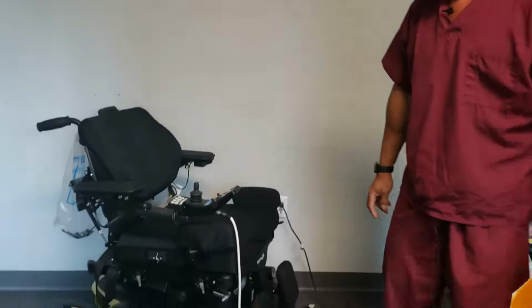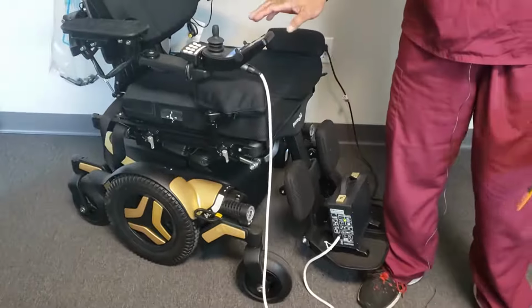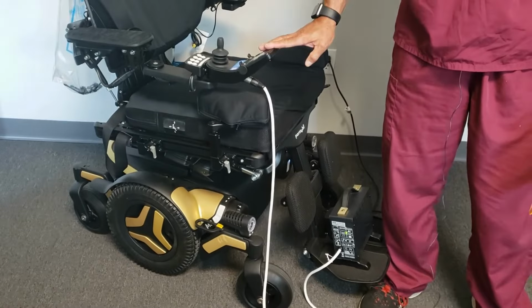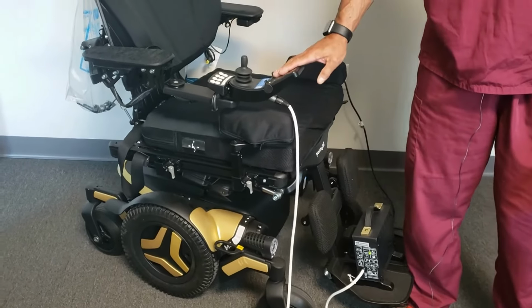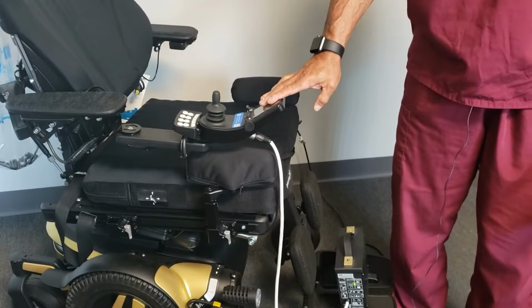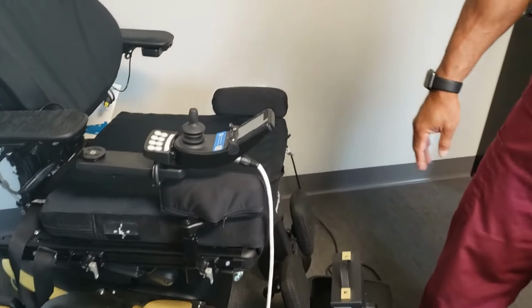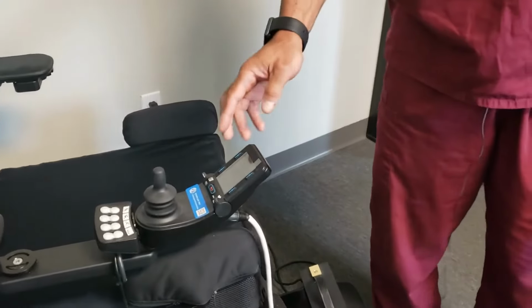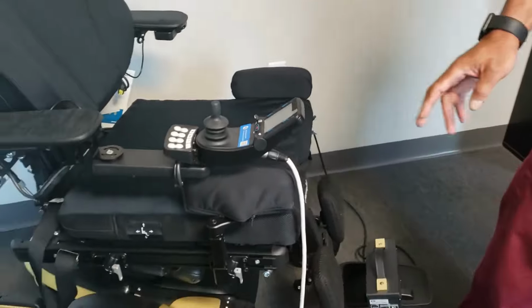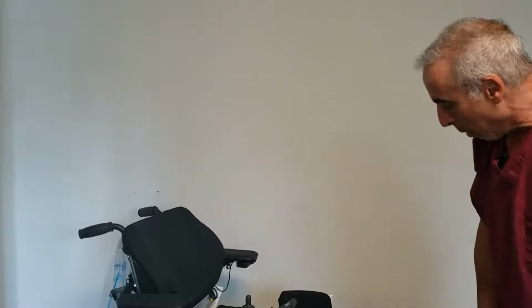The most common thing is that the chair will not go, and usually that's because it's in a lockout mode for safety. So once again, we're going to use our joystick to determine if that is the case. The joystick is the communication brain of the chair, which provides us with a lot of information of what's going on with either the drive mode or the seating mode. And that's the information that you want to pass on to your provider to help diagnose what's going on, so that we can rectify the problem.